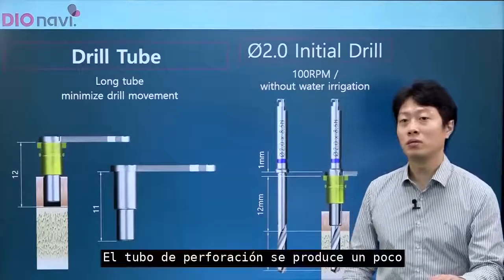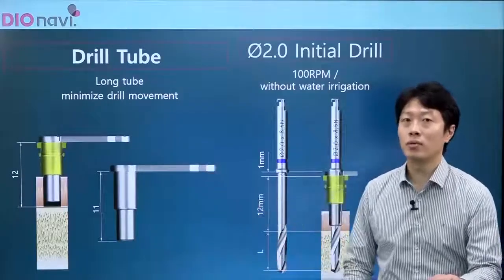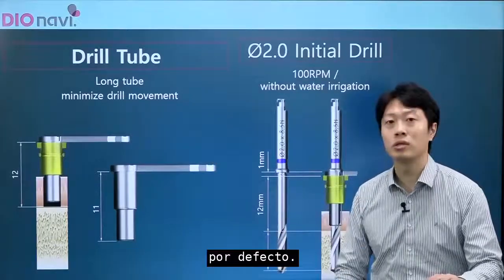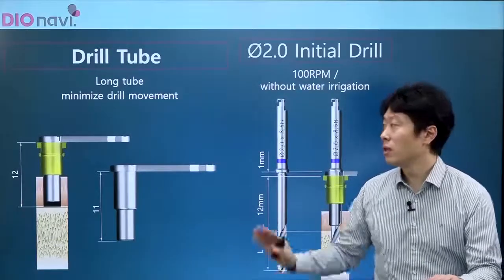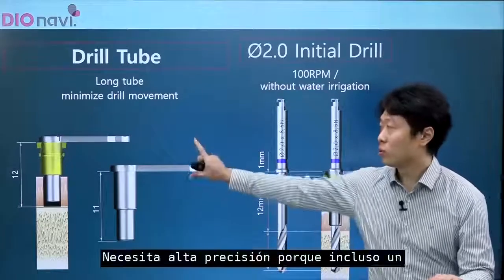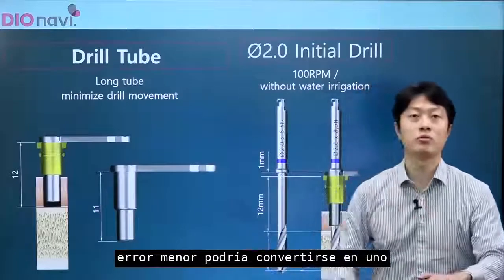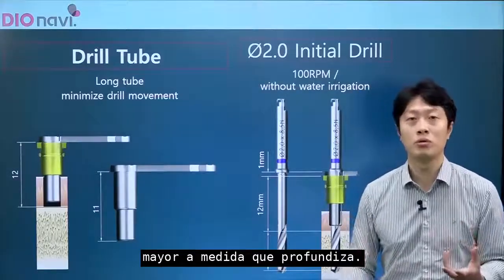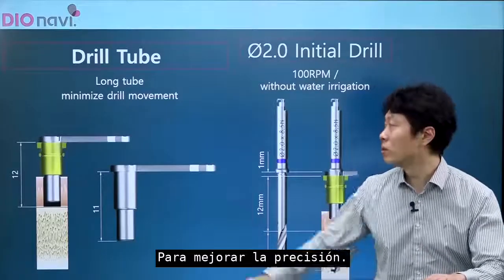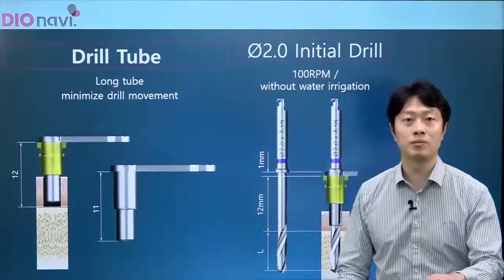The drill tube is produced slightly longer than the master kit. In the case of the narrow type, since the 12 mm offset is adopted as a default, it is prone to shake a little more. You need high precision because even a minor error could develop into a major one as you go down deeper. For improvement in precision, we have produced the drill tube in a longer shape.